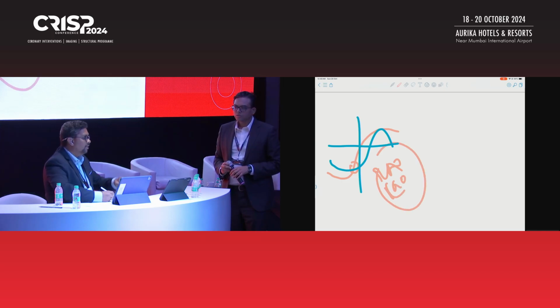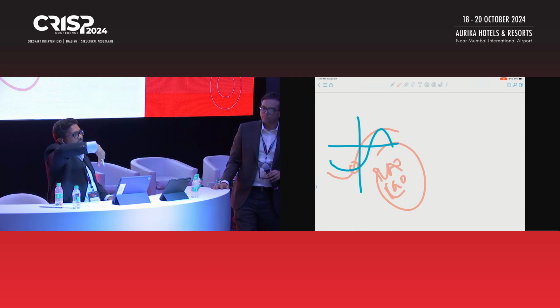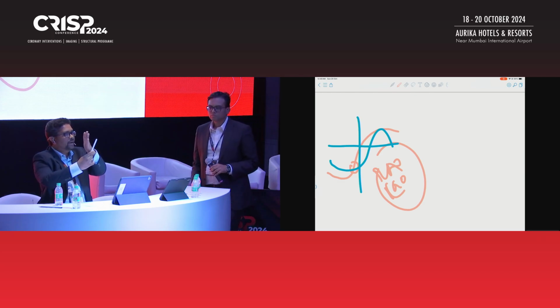So when Niccolo Piazza, the one who described these S curves, said the device is coming in a different plane and the aorta is in a different plane. So it's something like this. The plane of the aorta is like this, but the device is like this. The device is not like this. It's coming like this. So when it is going to open, we don't know that this is the right way to look at it.